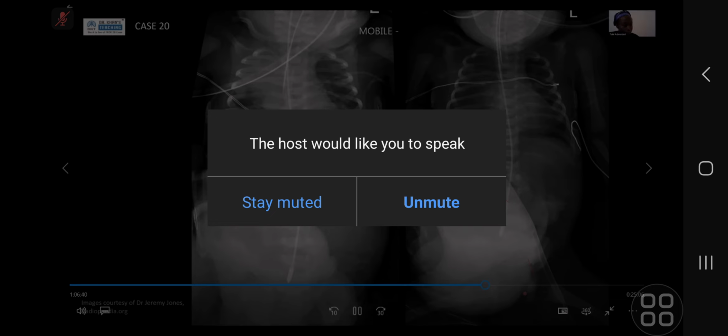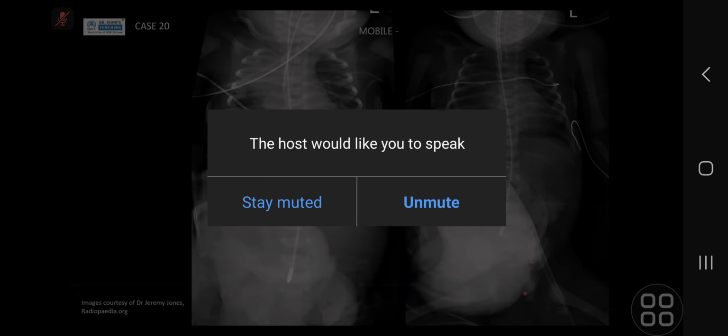I can see multiple lines. Are you going to have a go at the lines for me, please? There are some lateral cardiac lines, which are at the left apex and also at the right parasternal area. And then one line at the midline, up from the cervical spine until the lumbar spine. I am not very sure what line this is.